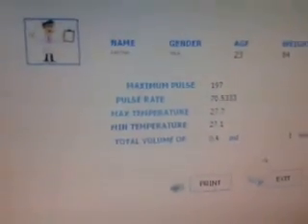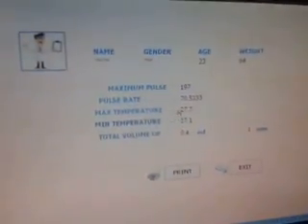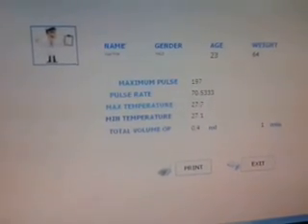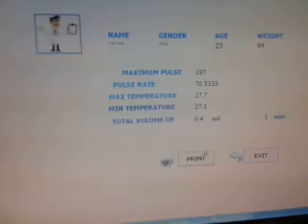So once the infusion is done, a report is generated. An option for report is provided. If we enter into the report, the amount of fluid infused into the patient, the maximum temperature of that patient, all the details are displayed here, which can again be printed.